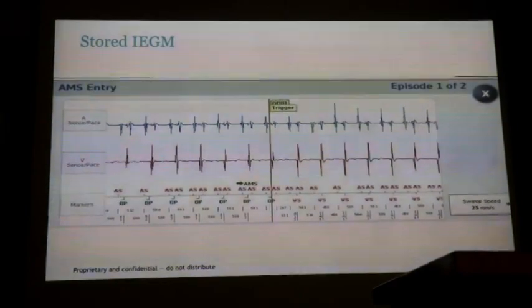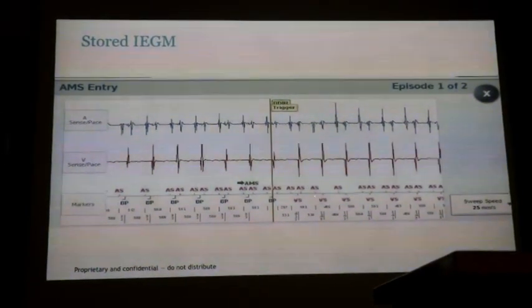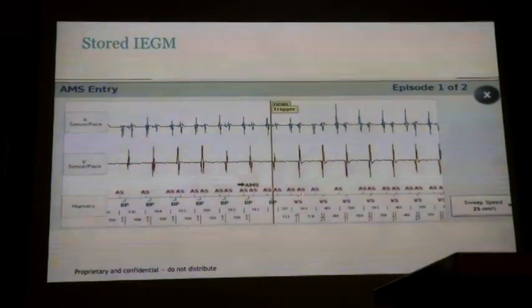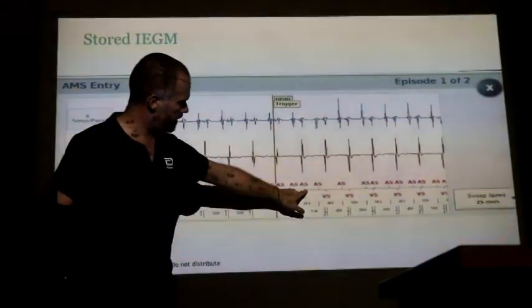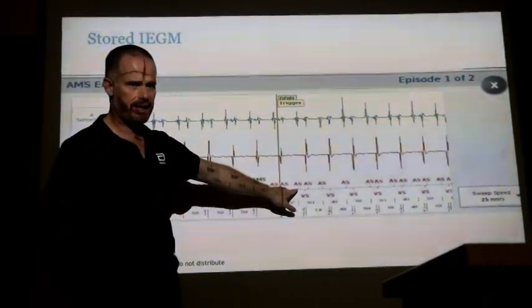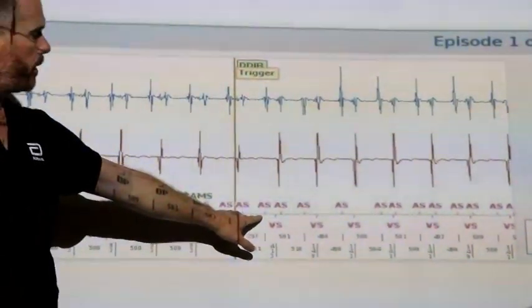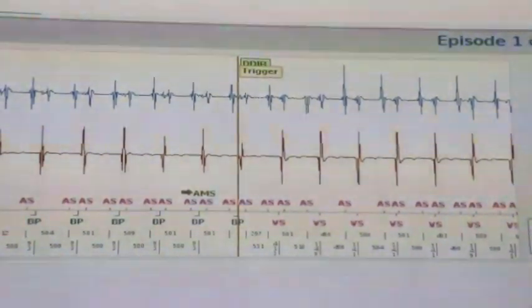There is a decay delay and threshold start on the P wave, but if we wanted to undersense this signal here, we would have to be changing the decay delay threshold start on this. That's a long way away, like 200 milliseconds away. So you'd have to be really insensitive on your atrial channel, and then if you went into real AF, with all the change of cycles, you'd miss loads, and you probably wouldn't mode switch.